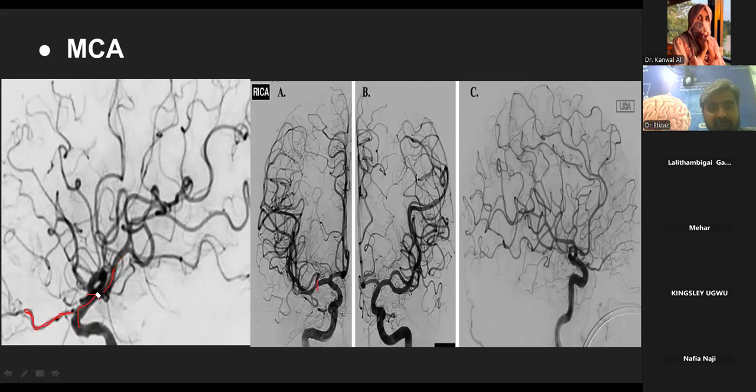Look at here. It is rising from the internal carotid artery. It is the ophthalmic segment. This is the clinoid segment, and this is the ophthalmic segment of this internal carotid artery. It is arising from the internal carotid artery. So don't be confused with it. Some say that it is frontopolar or different, but no, it is the ophthalmic artery of the internal carotid. Okay, so then it will be easy for you to memorize.